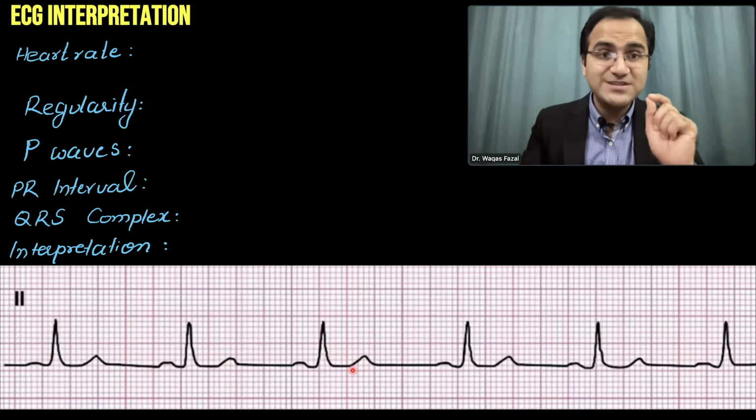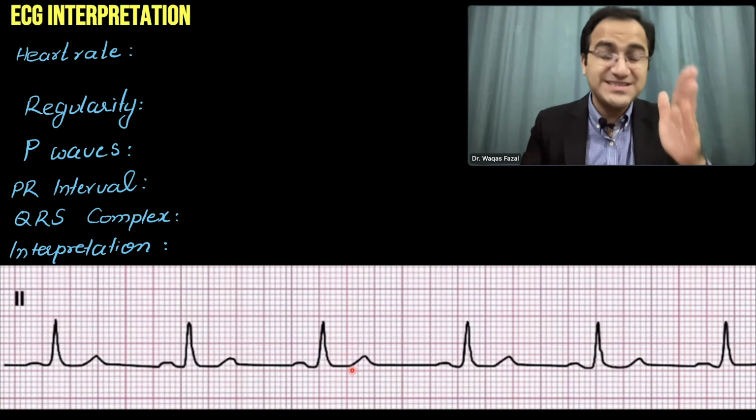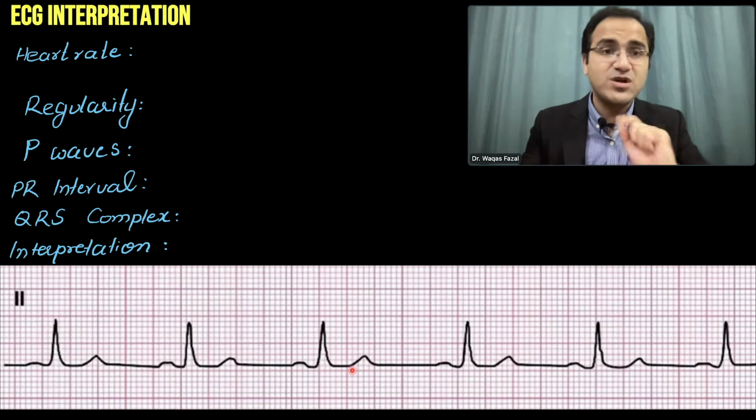Now what you should do is pause the video, take a piece of paper and a pencil and solve this ECG. If you don't solve these ECGs, you won't remember anything. ECG is a very volatile subject. You will keep coming back to the videos, but you won't learn anything if you don't solve these ECGs yourself. Pause this video and solve it yourself.